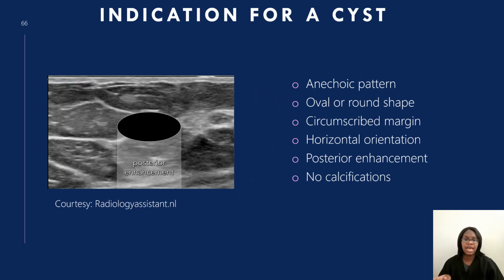If I'm going too fast, you can always pause it, rewind it. You can watch as many times as you want to. This is just an overview of breast ultrasound and the lesions that we find.